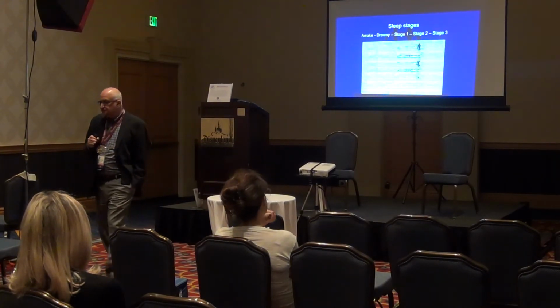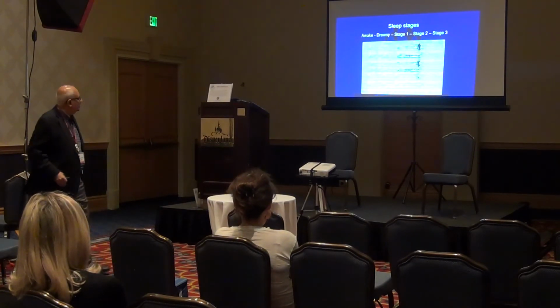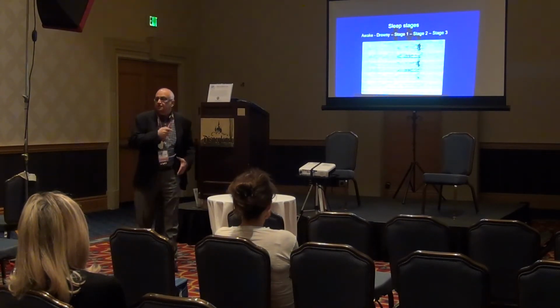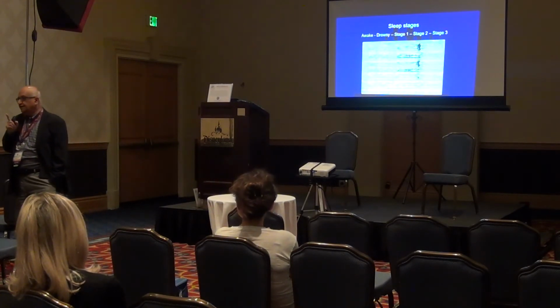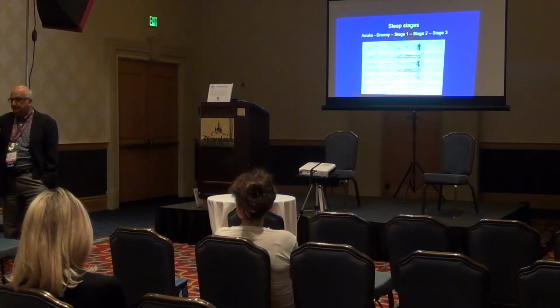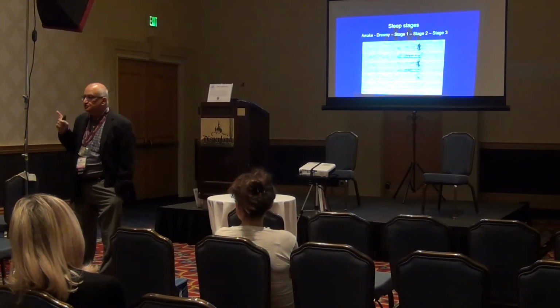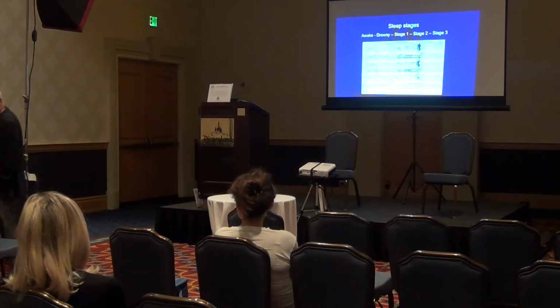Then we can also evaluate by EEG what sleep looks like. And right here, you're just seeing a normal awake one. You see a lot of things in the EEG that tells you why I tell parents when they're in the hospital, many of you have been there for an overnight EEG, I'm always telling them, don't look at the monitor. You're here to look at your child and document, right? We don't need you to be looking at the monitor and giving me notes.